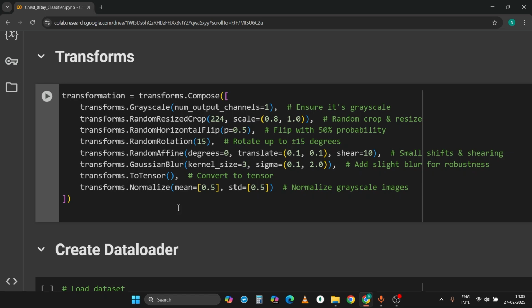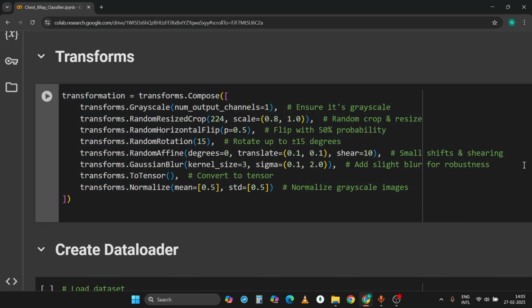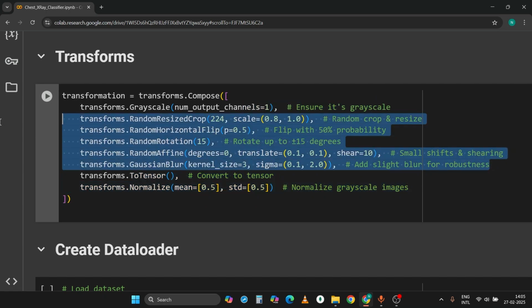Okay, this way we apply transformation, and this part from here till here does not need to be performed after training, at testing time. At testing time, only these two things and converting the image into grayscale are enough. This part is just required to add a variety of images during training time, so that our model gets robustness. So it doesn't require it after training.